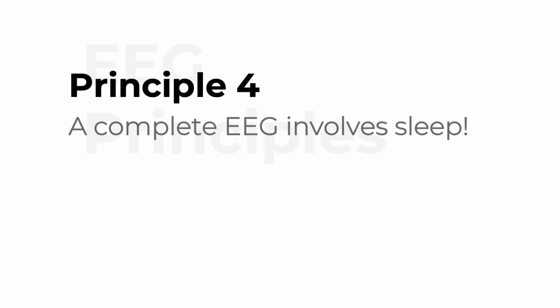The principle for today is that a complete EEG involves sleep. You tend to see certain features of an EEG better during sleep than wakefulness. There's less artifact. You may actually be more likely to see epileptiform abnormalities, that kind of thing. So essentially you want to capture sleep if you can in a routine EEG to have the best idea of what's going on.